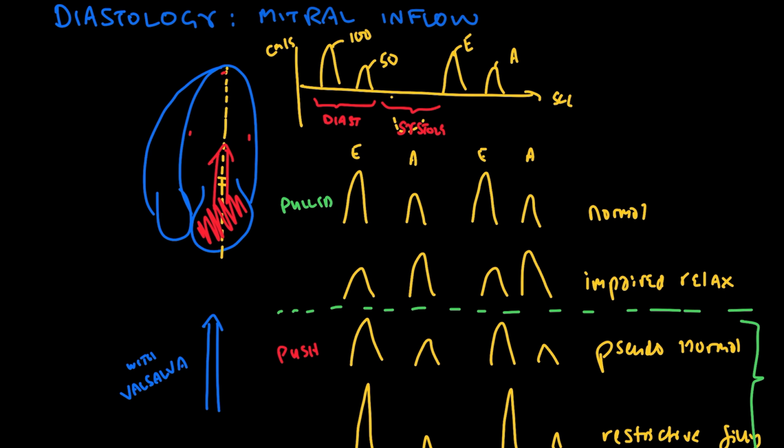And then as you can see in this information I have here on the screen from our previous video, looking at the mitral inflow, there are different patterns of the blood flow coming in through the mitral valve to the left ventricle. There's this normal pattern with a good amount of blood flow early and then some late. And then there's impaired relaxation where more of the blood is coming late in that atrial kick. And so atrial fibrillation could be a problem there for the patient.